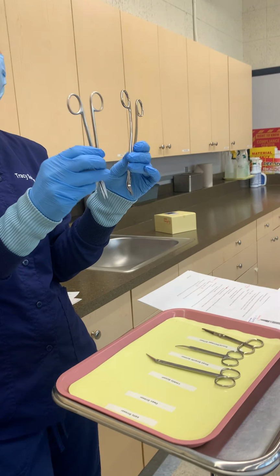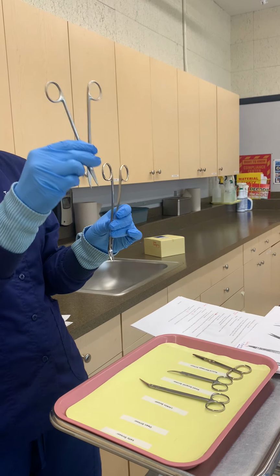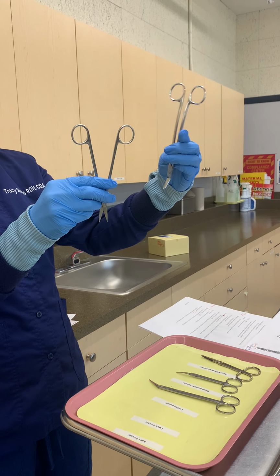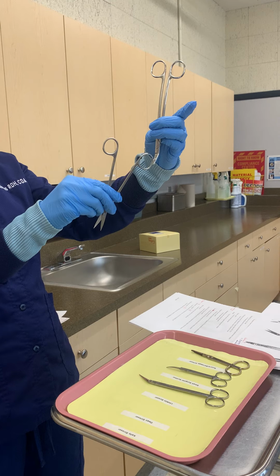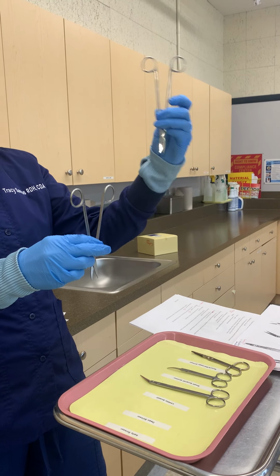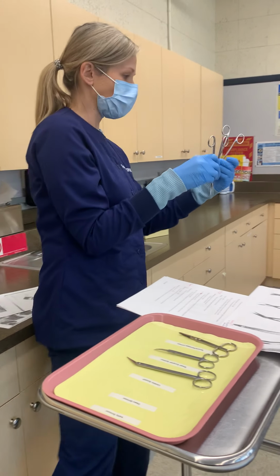But one way to remember these, okay, is Kelly is small and dainty, but Dean is flexing their muscle, okay, and curved. So see how it's curved and they're bending here? So there's a flex there, okay? So Dean is flexing his muscle and Kelly is small and dainty, okay?